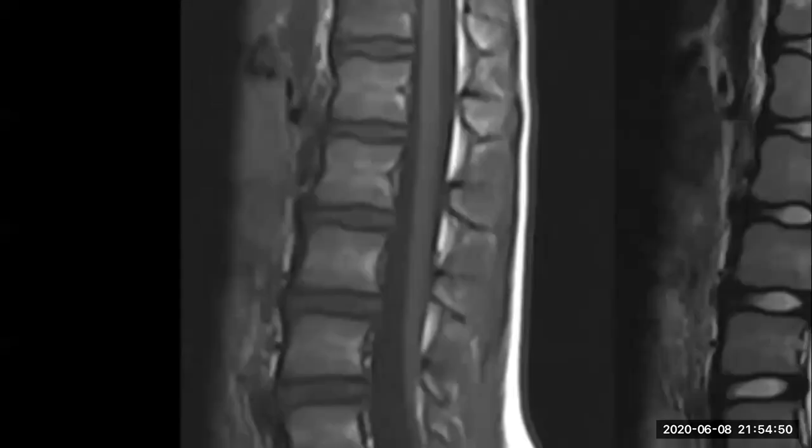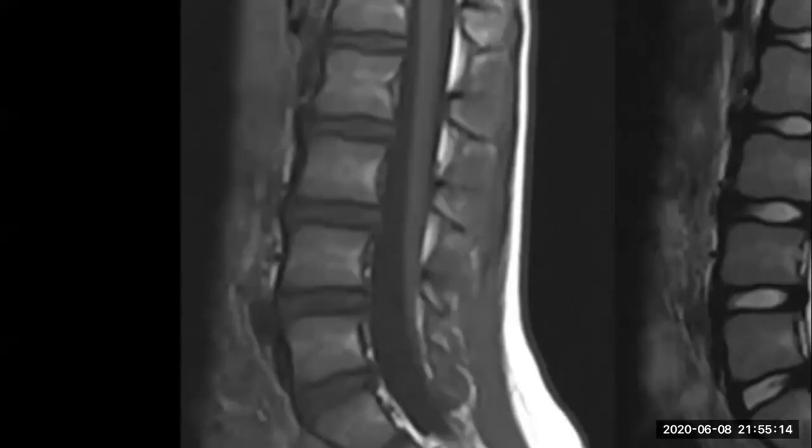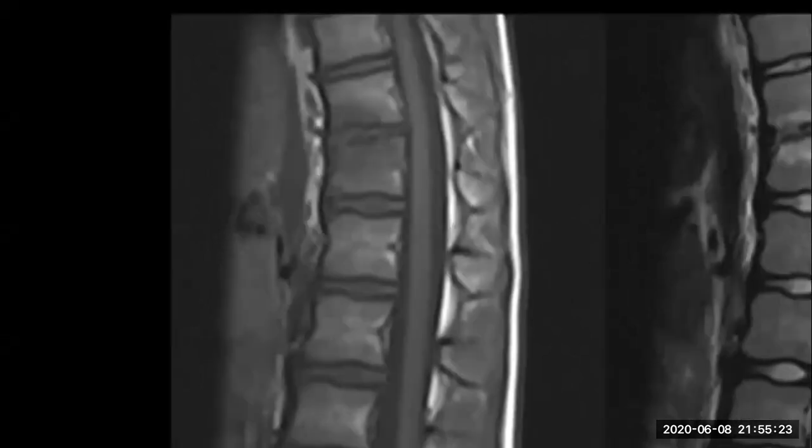The bone marrow. First thing, bone marrow. Second, the anterior superior corner, we call it limbus vertebra. You remember that? It is not ossified. Yes, okay, it is not ossified. So most of them here at that level, this is 5, 4, 3, 3 and 2, even here 1, and also here 1, T11, T12, it is not ossified. So this is a child.